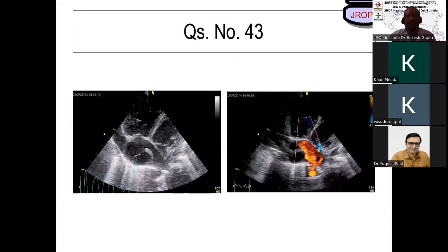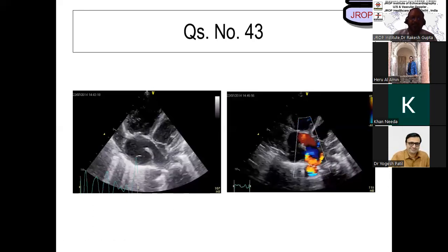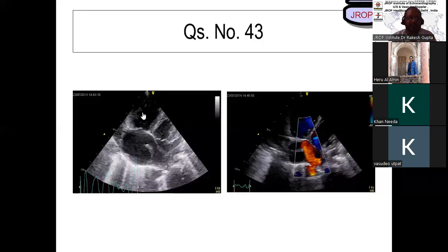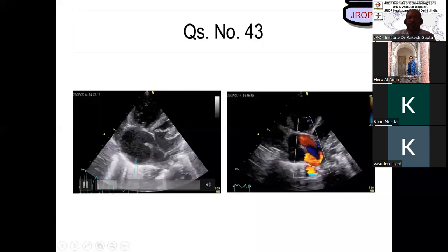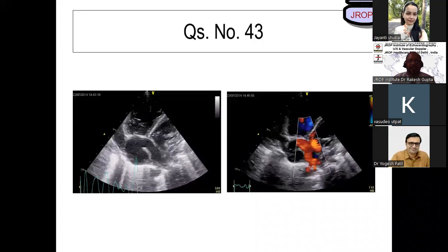No, it's tough. It's very tough. Eustachian valves. Tricuspid atresia. No, no tricuspid atresia. Both the valves are opening. Look at the valve is open. Something to do with atriums. This is total anomalous pulmonary venous drainage. Okay, look carefully.